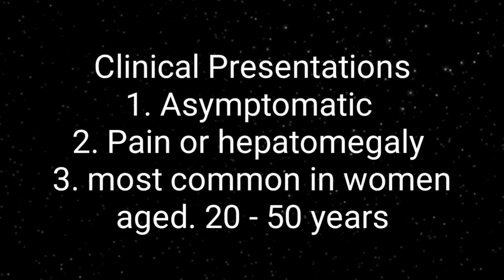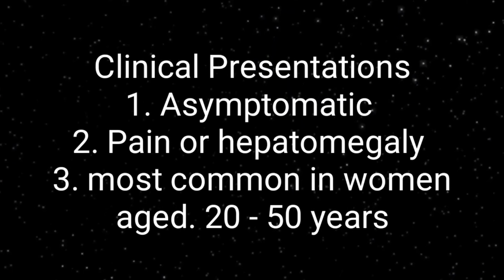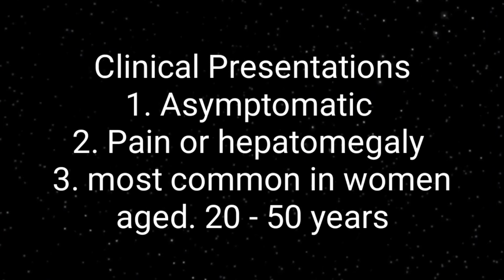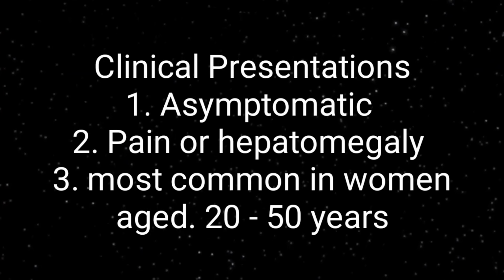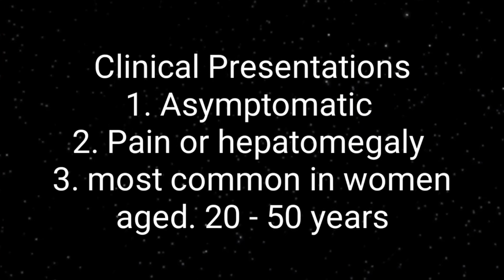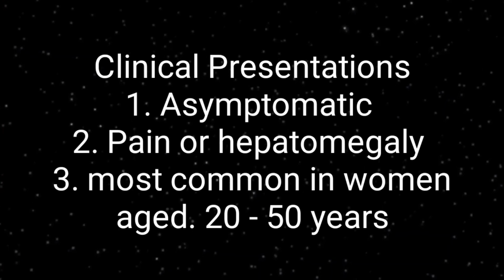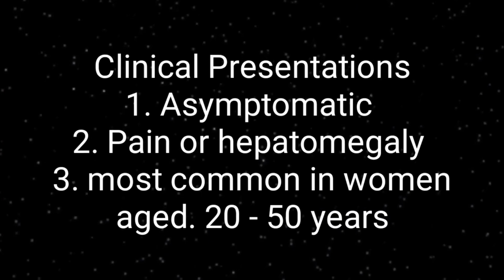There are certain characteristic features of focal nodular hyperplasia on ultrasound imaging, on non-contrast enhanced CT and contrast enhanced CT. However, MRI plays an important role in the detection of focal nodular hyperplasia. Scintigraphy also plays an important role in the detection of this benign nodule, and DSA can also be done. So let's start watching images for the ultrasound and for the contrast or non-contrast CT scan, how this focal nodular hyperplasia will appear on these images.